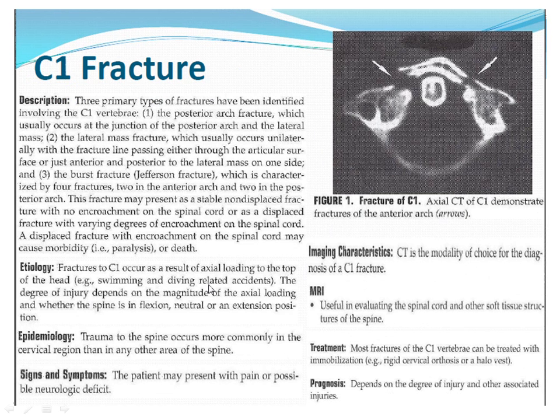This is another kind of vertebral body fracture, the C1 fracture. This can occur in the posterior arch, or the lateral masses, these parts, or in the anterior arch, or it can be all three. Sometimes they just break it in all three places. These are known as a diving injury. Usually people dive into water that's too shallow and they bang the top of their head, and this is another thing where the axial loading causes it to kind of burst out.